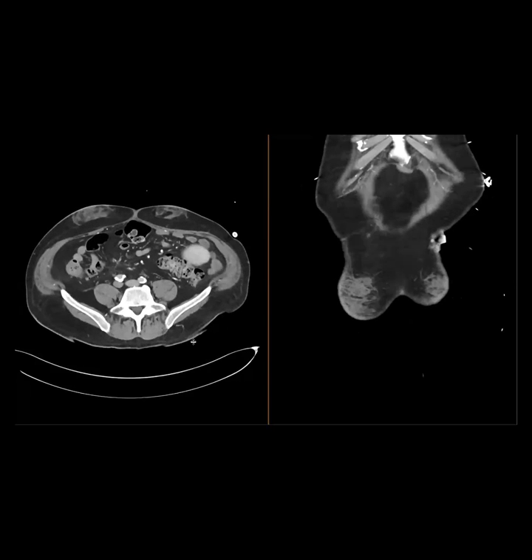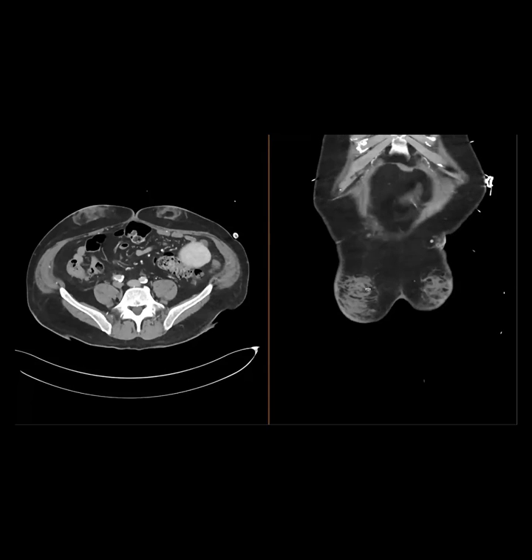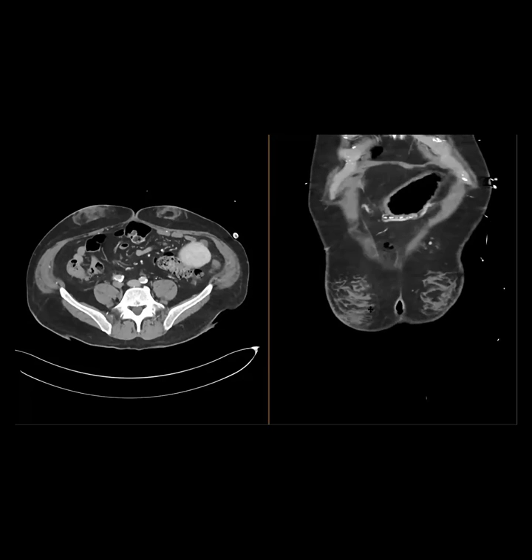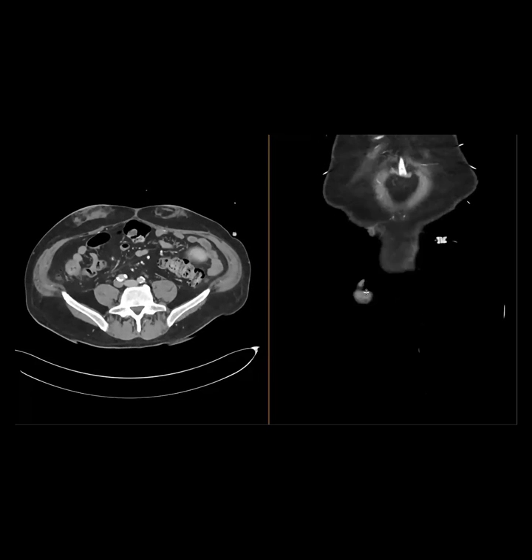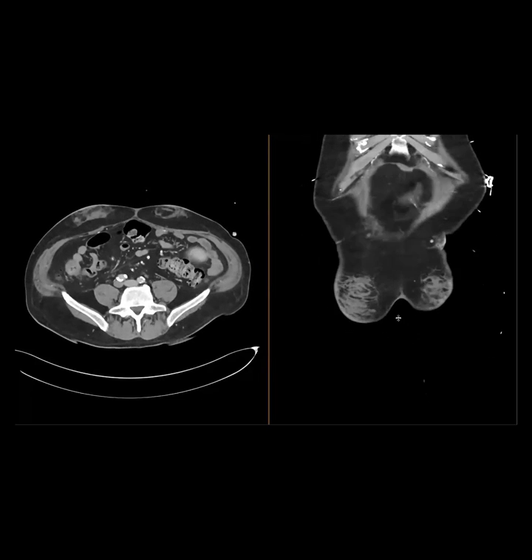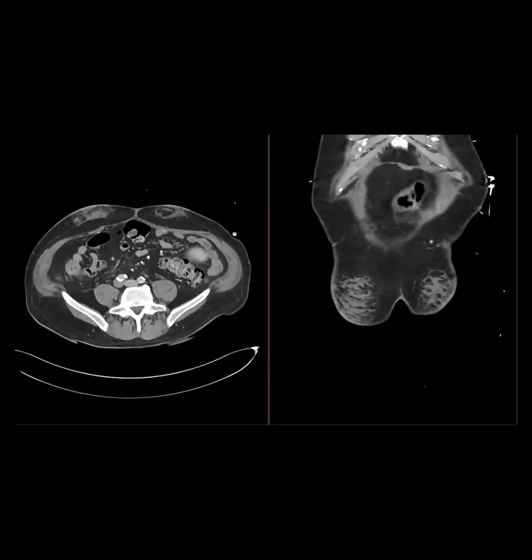Is it like a diabetic lipodystrophy? Yes, lipohypertrophy. These are from insulin injections, and they usually alternate sides, and so it causes this focal change. They call it lipohypertrophy, but that's kind of a misnomer because it's not the fat that's enlarging. It's the soft tissue here, and so they can look like abdominal breasts almost. And I think Cookie wrote a paper on this.